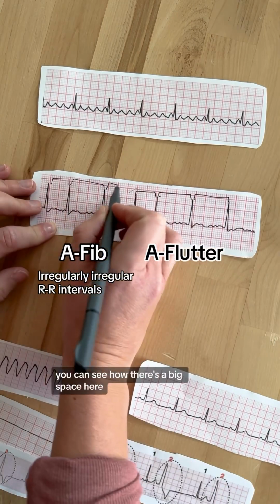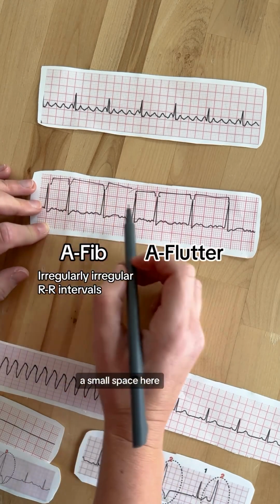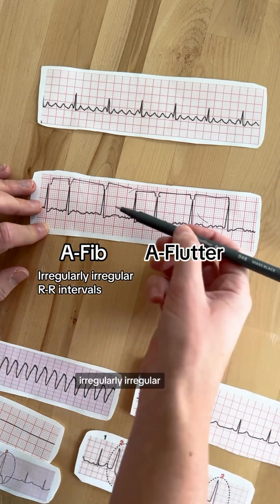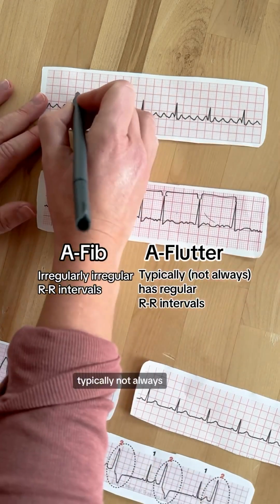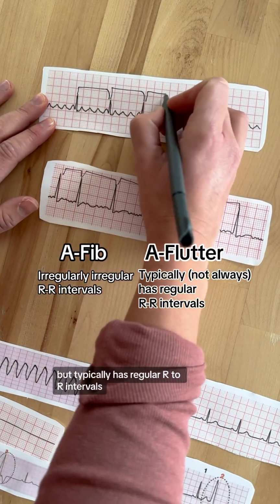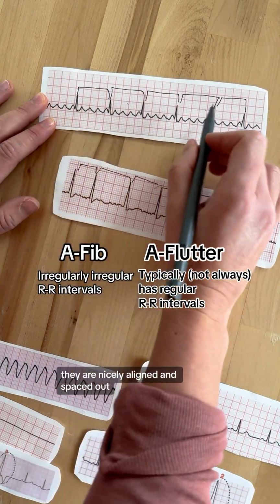You can see how there's a big space here, a small space here, a small space here, and a big space. They're irregularly irregular. Whereas atrial flutter typically, not always, but typically has regular R-to-R intervals. They are nicely aligned and spaced out.